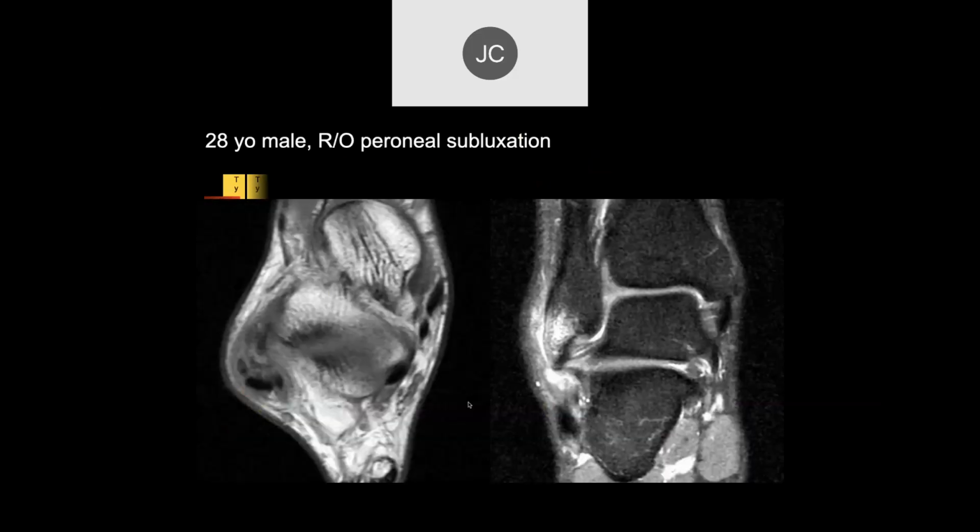Okay, Tayson. All right, so looks like we have edema at the distal fibula, and split tear of the peroneus brevis. Right. Good. And this is one of the most common abnormalities that we see of the peroneal tendons. It's just tenosynovitis, but then the split tear of the peroneus brevis. The brevis is anterior, the longus is posterior.